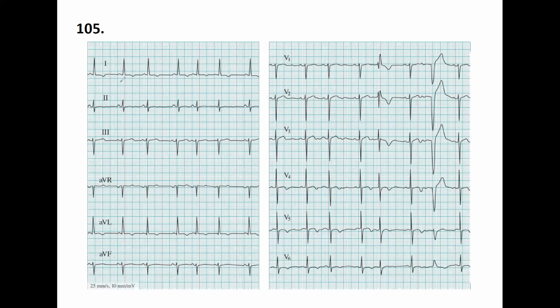You are looking at 105. Look at this distance and compare it to this distance, or this one. It is not rhythmic. By looking at it immediately, you can see this is arrhythmic for sure, because the distances are different. As another thing, we do have P waves, but this P is not the same. If you get a little bit closer, you will see that these P's are not the same. In the next lesson, you will figure out what it can be.